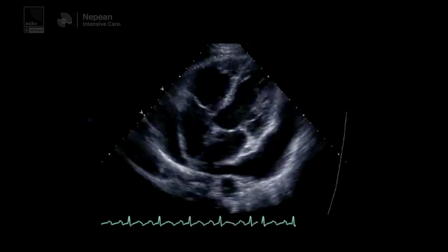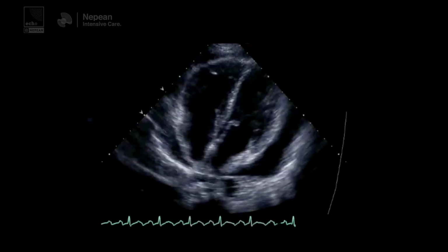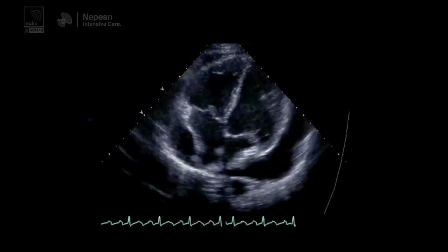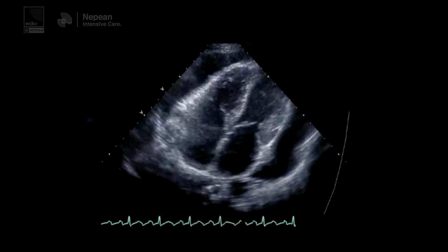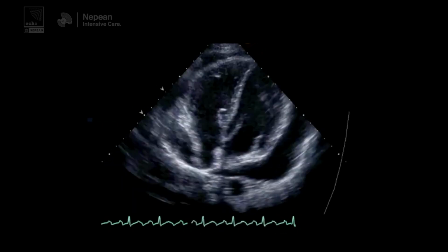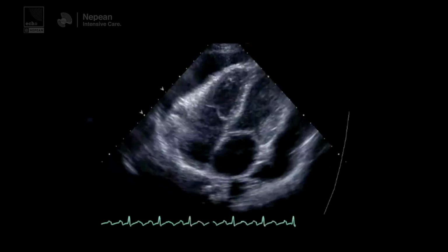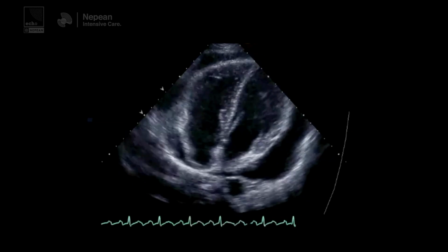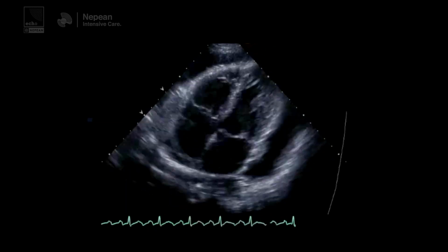We talk about more than a third of the cycle. If your right atrium is collapsed for that long, it increases the sensitivity for tamponade. But none of these markers, as we said, are 100% sensitive or specific. But yes, you'd be looking at end systole, more than a third of the cycle. So you'd need to pause, scroll back, slow that down and check how long it's collapsed for. That's often what I do.